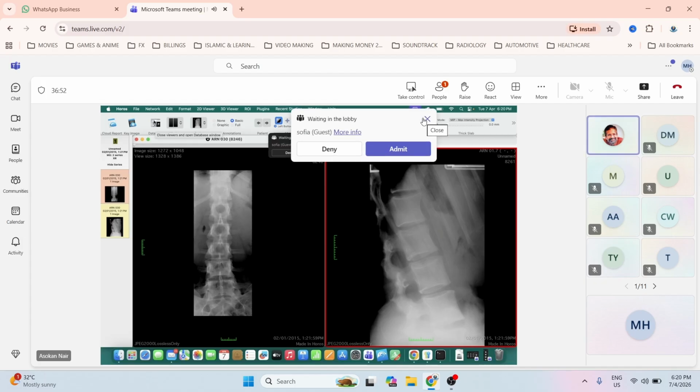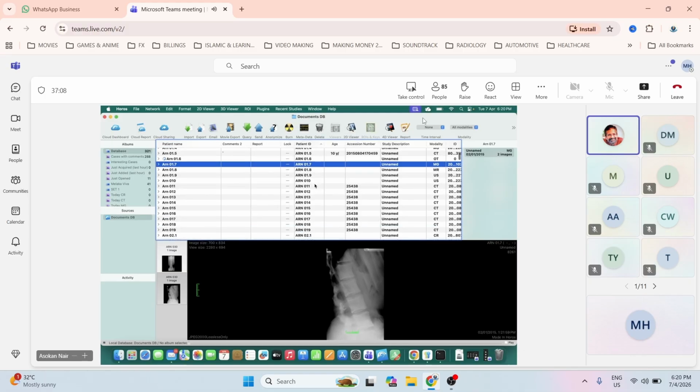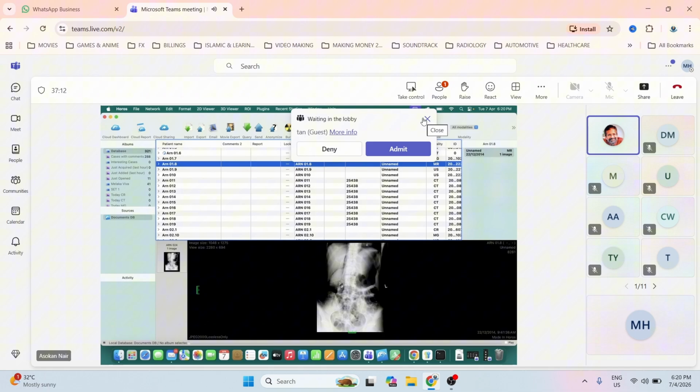Okay, so this is a case of dural ectasia. So there are many causes. Then you start thinking, what are the possibilities here? See, this is how the exam is. They want to discuss. They want to make you think about possibilities and come to something. Okay.